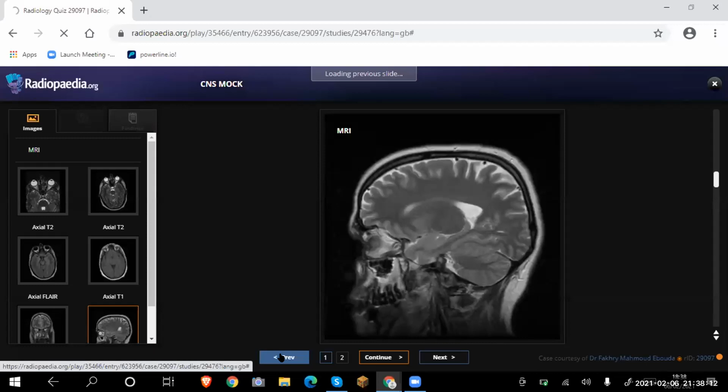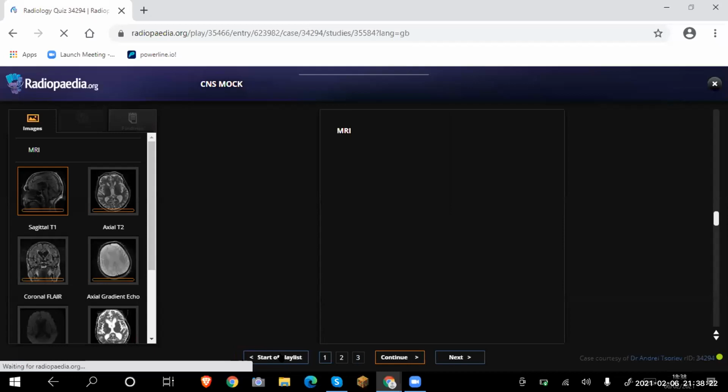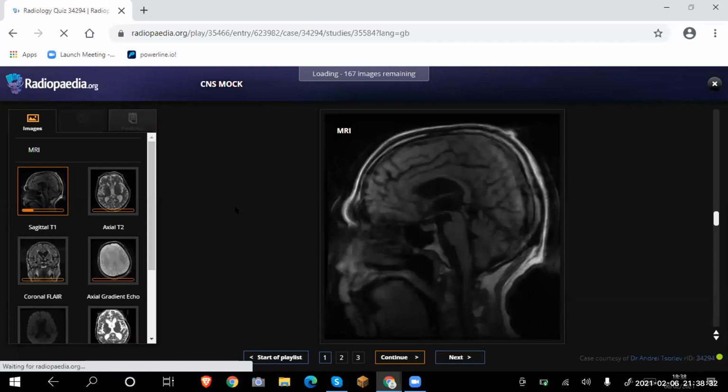So the first one was a case of normal pressure hydrocephalus. The name you call it is not a very common name, actually. I've also come across that name once, but I can't remember the full name myself. But it's commonly called normal pressure hydrocephalus. And the features are, like you mentioned, there's ventriculomegaly, but there is no obstruction. So it's a non-obstructive ventriculomegaly.